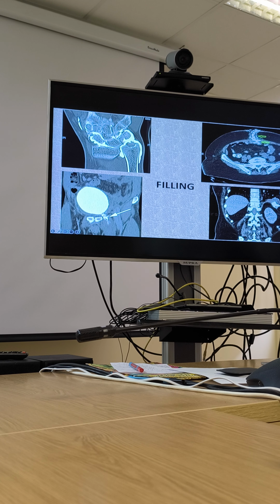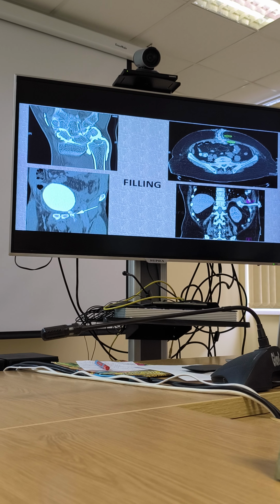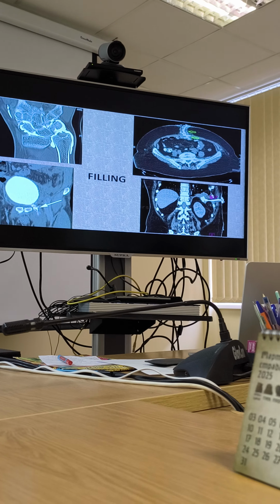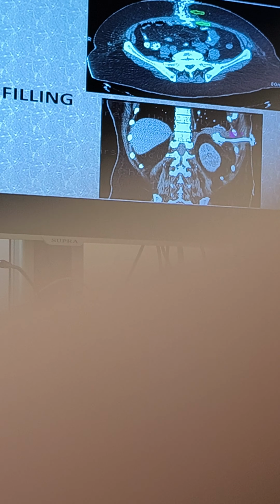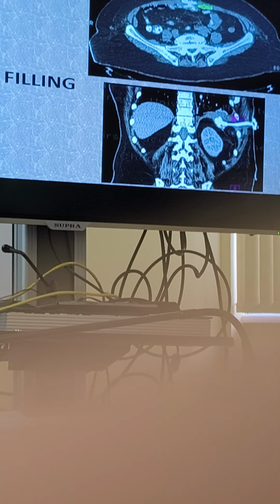These are fistulas, which are between colon and skin. And since these are tubes created by disease, the best idea to look at them is filling this tube. This is the same thing we do in traditional X-ray.